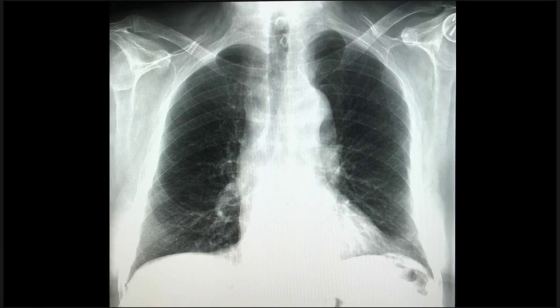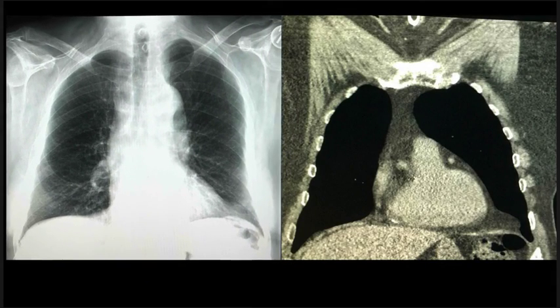What about this situation here? Now, let's take another look right there. It's blurrier, right? Sort of more extreme blurry. So what is that? What is going on there? So let's bring in some cross-sectional imaging and let's try to figure out what's going on here. So same patient, and if you look at that left heart border, you'll notice that there's this thing right here. Well, what is that? That is fat. Now, it's normal to have a little bit of fat around the heart. Some people have more of it than others.